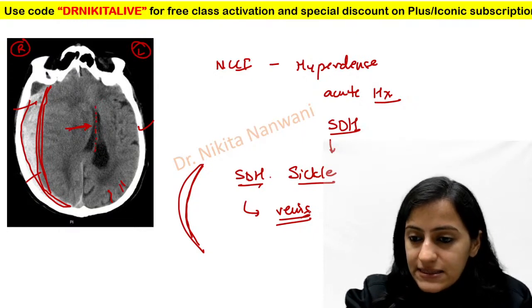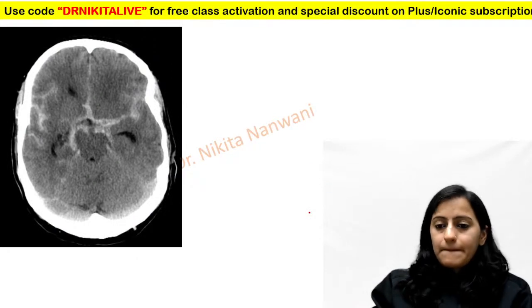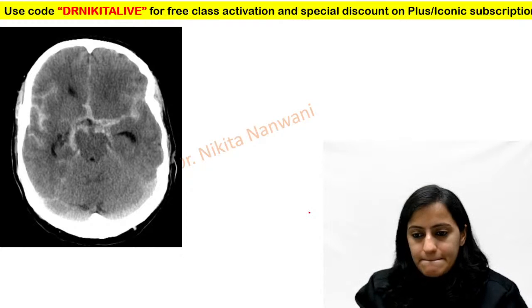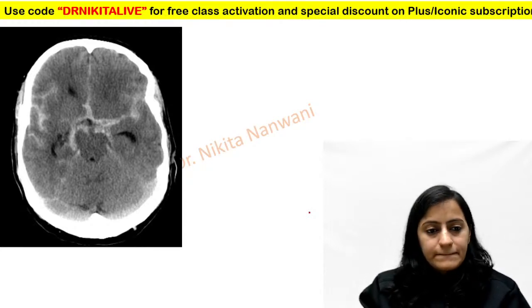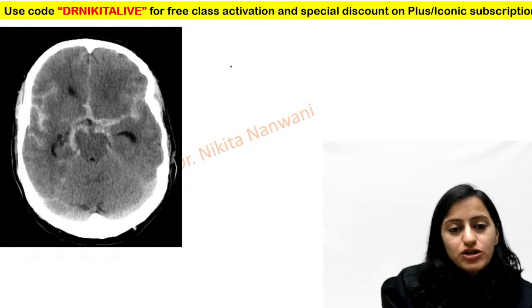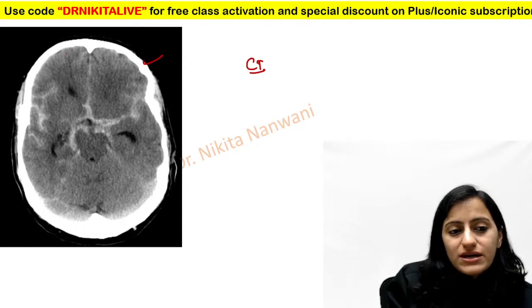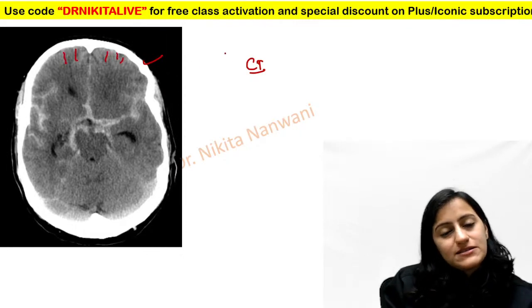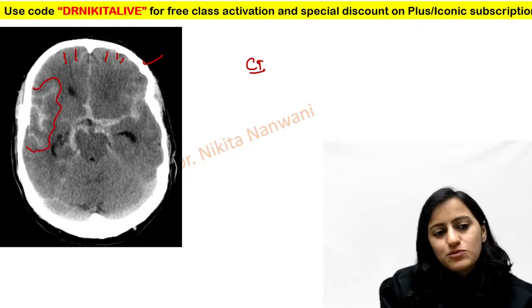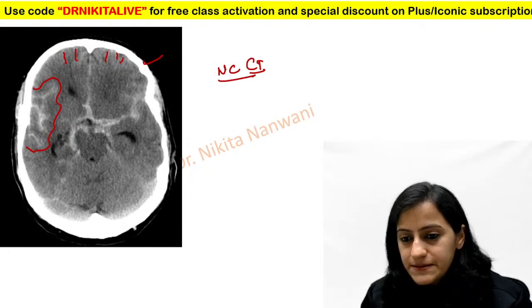Let's see the next type of hemorrhage here. What do you think is this? Is this a contrast CT or a non-contrast CT? This is a CT because the bones are white. It's a non-contrast CT because not all the sulcal spaces are showing the white thing. You see something white in this sulcal space. What is this area anatomically?